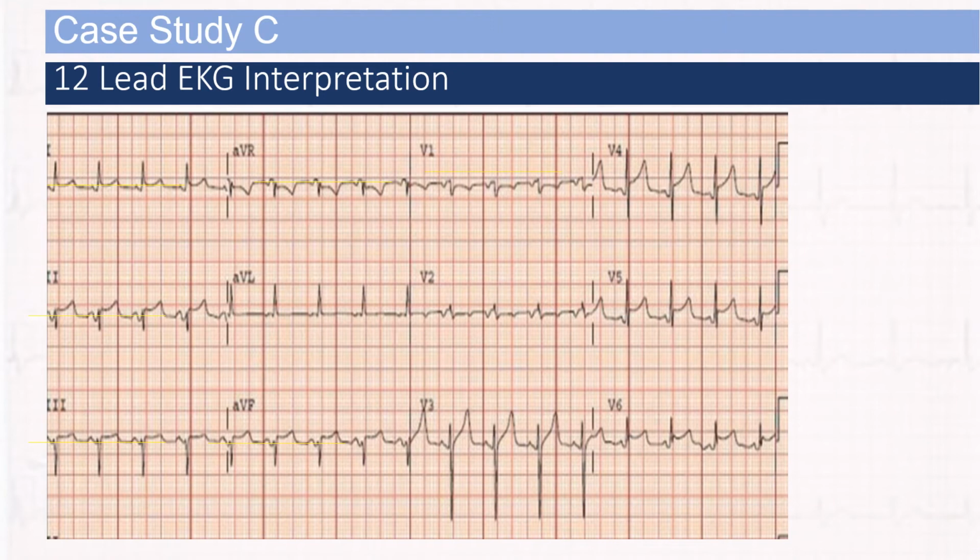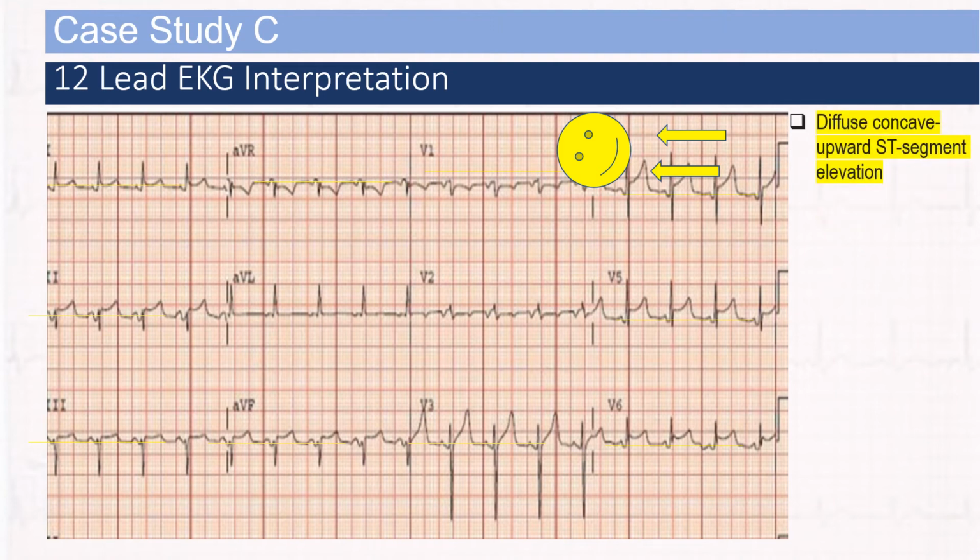There is ST depression with flipped T waves in V1 and flipped T waves in V2. V3 has elevation, like V4, V5, and V6 all have ST elevation. But look at the morphology of the T waves in the ST segment. There are concave and convex ST segment morphologies, and they are indicative of two different processes. So let's look at interpreting this 12 lead.